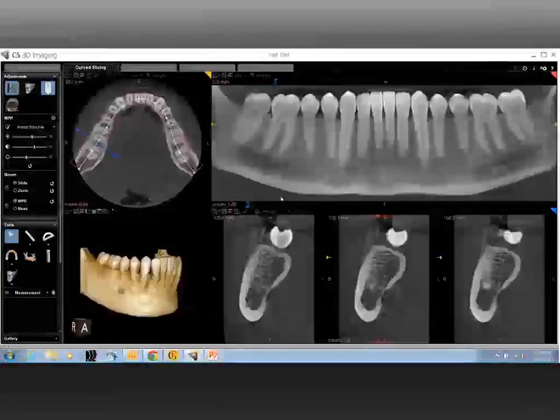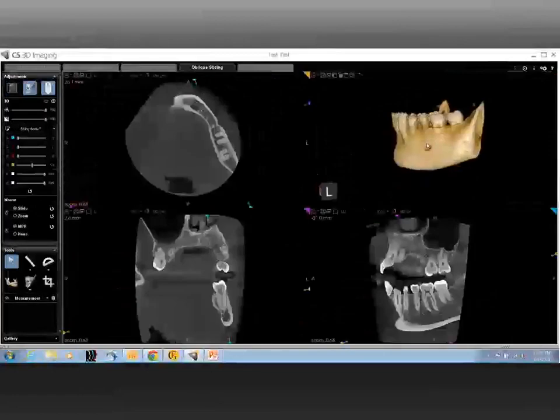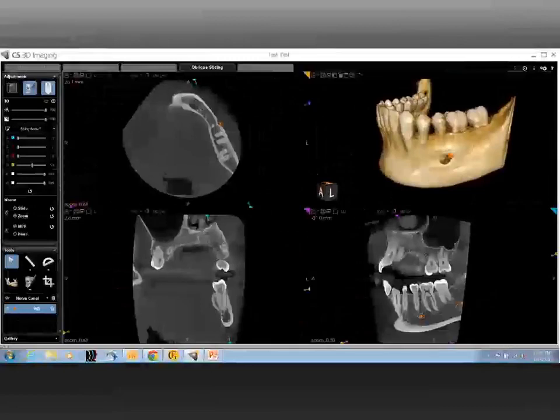That's a good question. As an extension to the previous answer, once all those things are evaluated, maybe the angulation of the ridge, the lingual undercut, and the morphology of the ridge have nothing to do with endodontics, but the inferior alveolar nerve and the foramen do have a critical role to play. Now, specifically to endodontics, canals. Why do we scan a patient for endodontics? To identify the radicular anatomy.